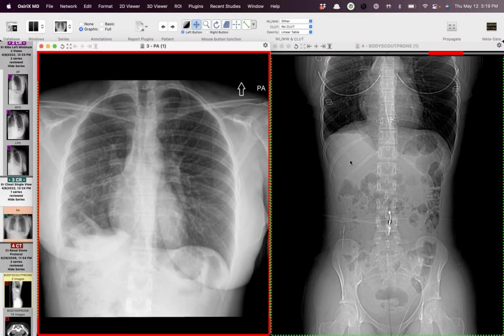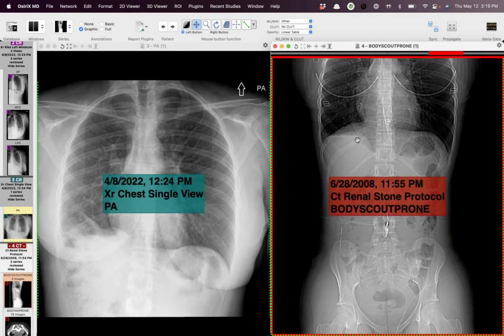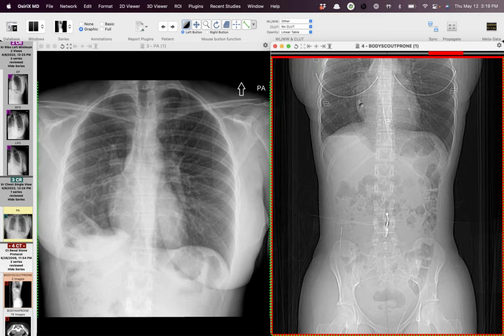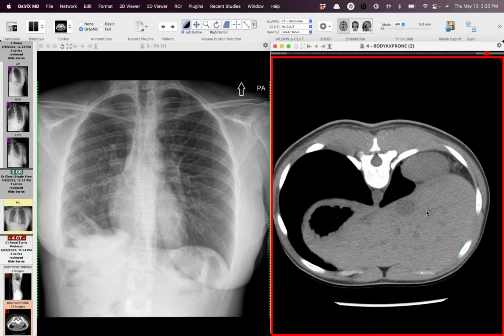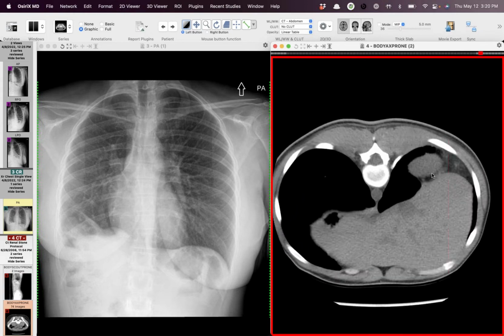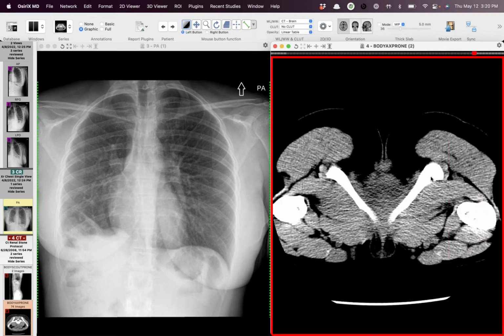But they went digging and found that she had had a prior renal stone protocol CT, and let's see, when was this? It was 14 years prior. And you can see on the scout clearly the scimitar vein here, but notice the diaphragm doesn't look as abnormal. So the question was whether or not there was some traumatic diaphragmatic injury as well, since this was a trauma. And looking back at that old CT, unfortunately, they did a very good job of collimating off the lung bases. But it looks like this is the right side, but back there, she already had some sort of diaphragmatic defect.